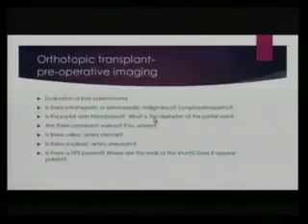So when you're doing the preoperative imaging, you evaluate the liver parenchyma. You look for intra or extrahepatic malignancy. Is there any lymphadenopathy? Now, when you start reading these cross-sectional images on these patients with HCC and those who have just Hep C or Hep B and don't have HCC, you notice that everybody has enlarged lymph nodes, it seems. Celiac, portocaval, portohepatis, and the great majority of the time they're just benign hyperplasia. So you mention it, but the majority of the time it's not going to preclude them from getting a transplant. The surgeon will do a biopsy, however, on the largest node to make sure it's not malignant if the patient has HCC.